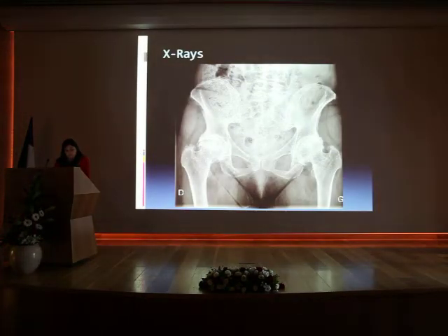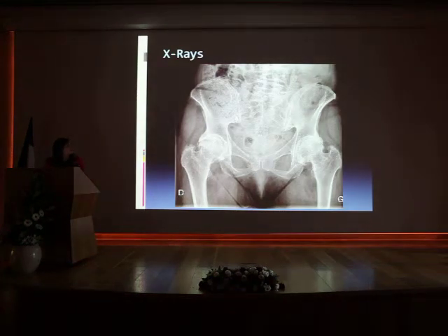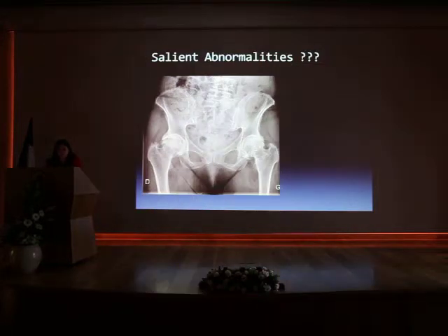So, here are her x-rays, and what do you think about it? I repeat, she suffers from both hips. She is 62. Any idea?